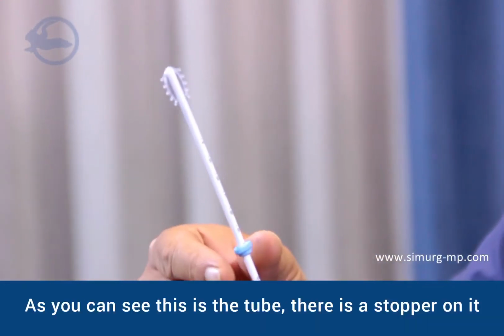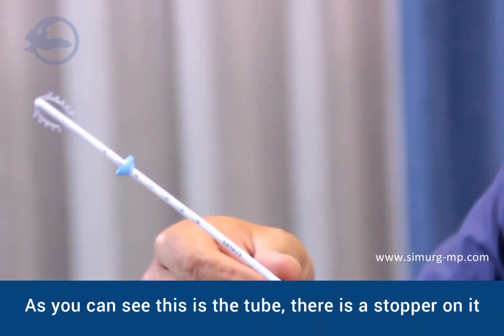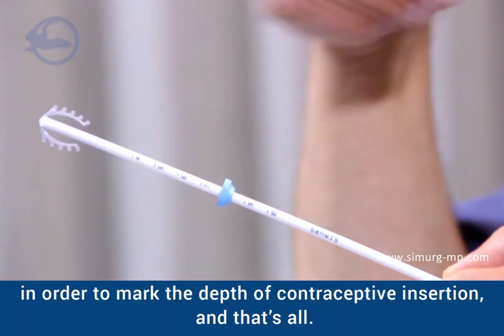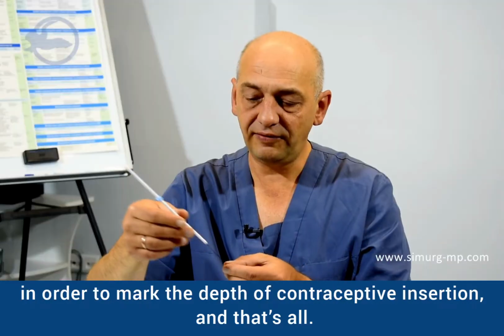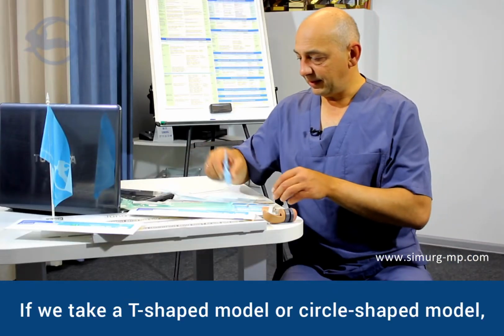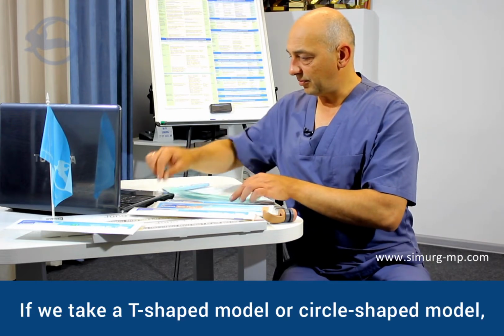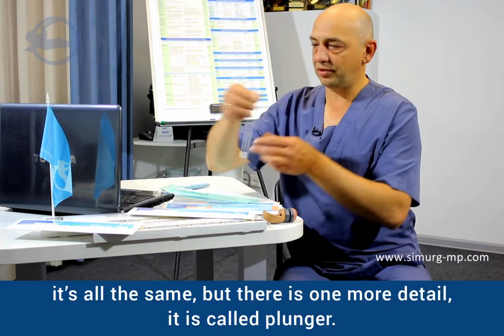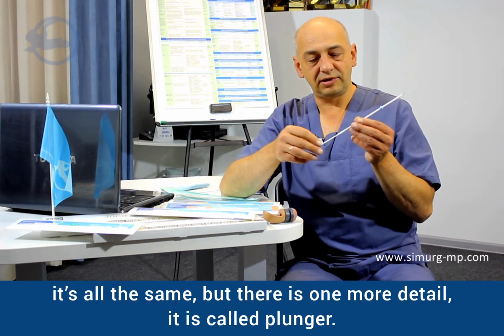As you can see, this is the tube. There is a stopper on it in order to mark the depth of contraceptive insertion, and that's all. There is no plunger in it. If we take a T-shaped model or circle-shaped model, it's all the same, but there is one more detail. It's called plunger.